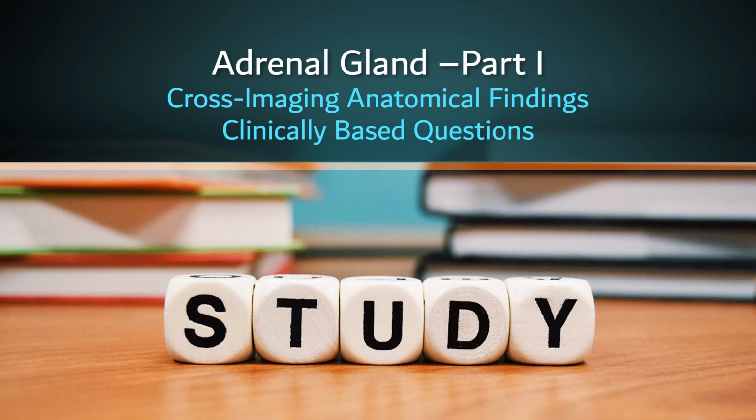In this video, we'll discuss important anatomical findings of the adrenal gland on cross-sectional imaging. These are clinically based questions. You can pause the video after each question to give yourself a chance to think and answer.